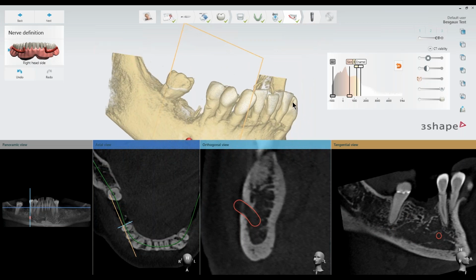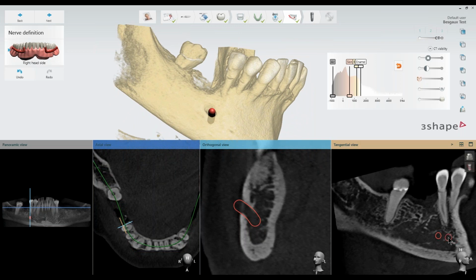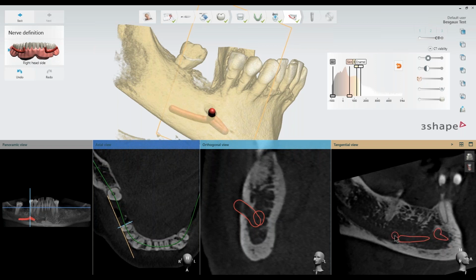In this case, I don't need to mark the frontal loop that normally is available for this nerve, but to do that, you would just browse until you see that opening. And once you've gotten to the end point of that loop, you just have to have the line overlap itself as you continue back. I'll browse back to where that nerve seems to be at its widest, because that should be the center of it. And just keep working my way back.